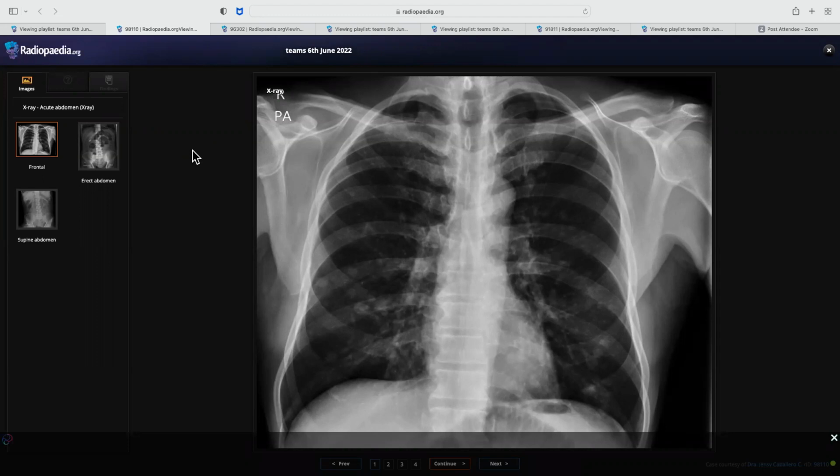No evidence of any bony lesion. The mediastinum and the rest of the costophrenic and cardiophrenic angles look normal. There is some prominent bowel loop seen just under the diaphragm.